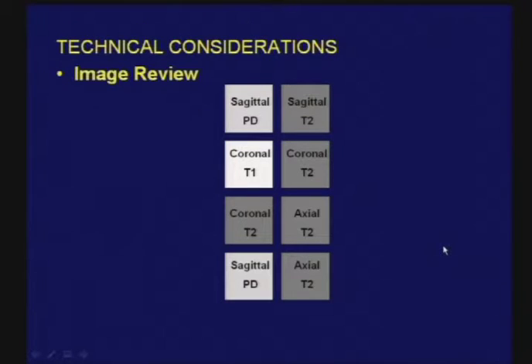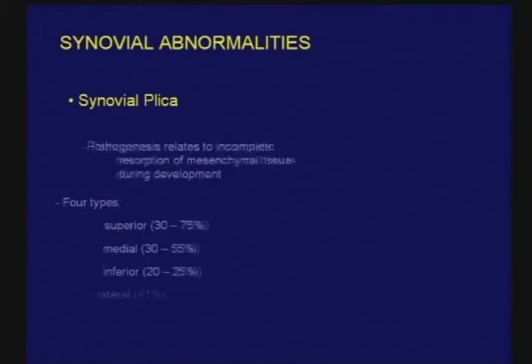This is the way I review images of the knee. I typically start sagittal, then coronal, always going anterior to posterior in the coronal plane, and then I mix the coronals often with axial, always going superior to inferior in the axial plane, and then various switches after that.